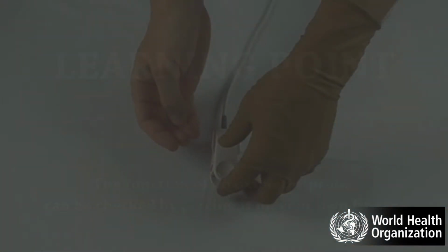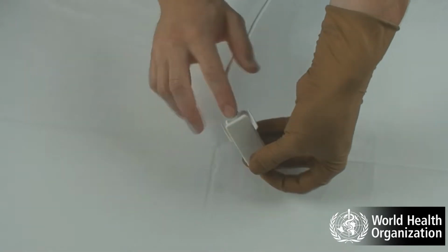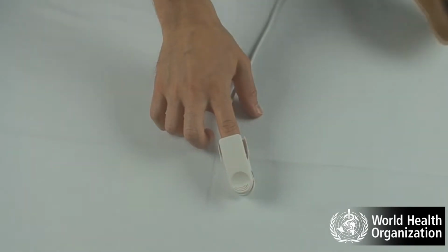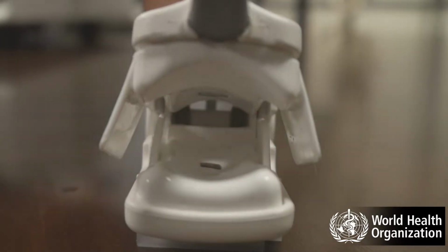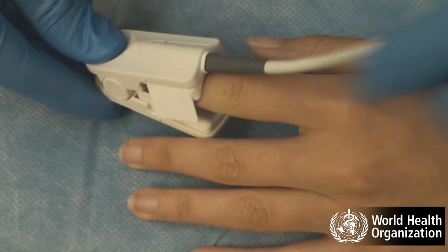Learning point. The function of the oximeter probe can be checked by placing it on your own finger. If no signal is obtained on the oximeter after placing the probe, check the following. Is the probe working and correctly positioned? Check that the probe is emitting a red light and try another placement site.